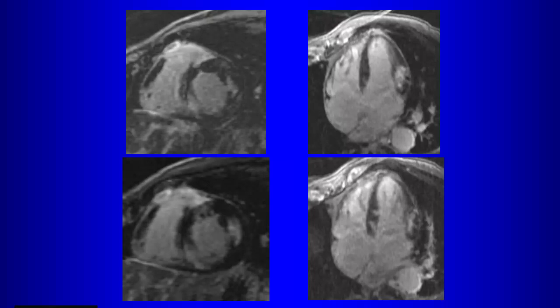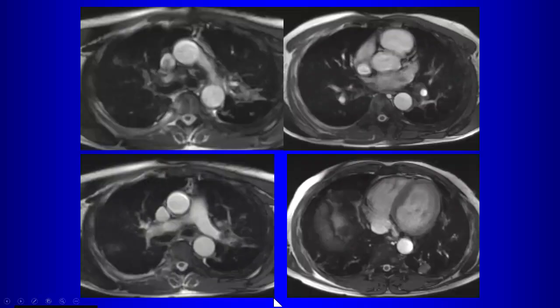Chagas disease, although it's not the characteristic appearance of Chagas disease, right? We'll get back to that. Anything else? Well, sarcoid is certainly something to consider, right? Another thing to consider in your differential. And then what's the finding here on MR? No, it's not a PE, that's partial volume averaging. But it's averaging from what?